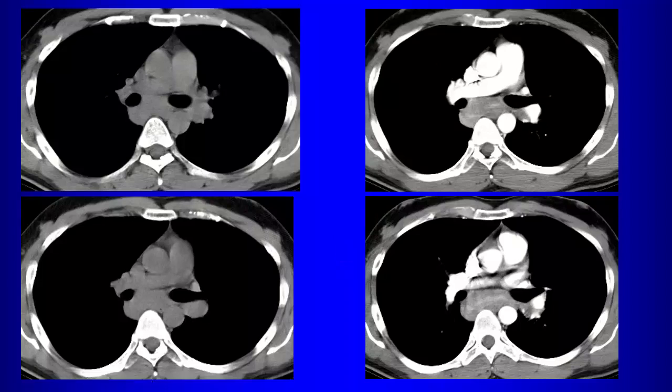You mentioned an esophageal tumor. What esophageal tumor would you consider here? I don't know. Not really, because that tends to give you circumferential thickening of the esophagus. Again, those lesions, the adenocarcinomas tend to occur distally, the squamous cells a little bit more proximally, but those tend to give you obstruction, right, and circumferential thickening of the esophagus.